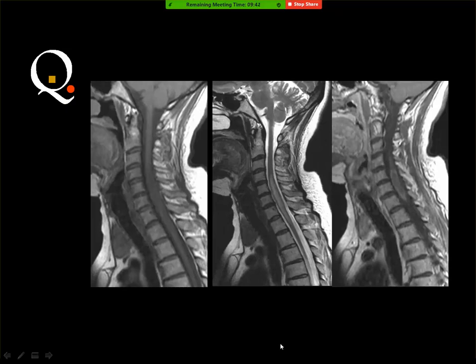Intramedullary. Astrocytoma. Ependymoma. For ependymoma, you should have a solid component. For astrocytoma, you should also have a solid component. And you remember in the lecture that ependymoma is characterized by hemorrhage, and this is one of the important diagnostic signs. But if you see a longitudinal abnormal signal within the spinal cord, then the diagnosis is transverse myelitis, and transverse myelitis can sometimes enhance. Transverse myelitis is not a diagnosis. It is just a description for differential diagnosis.